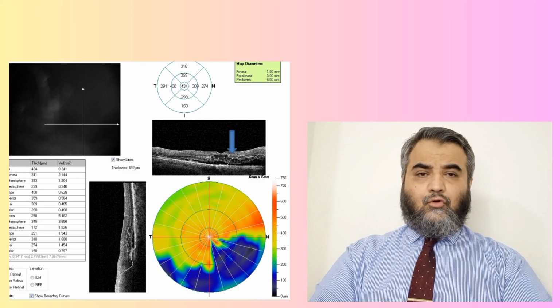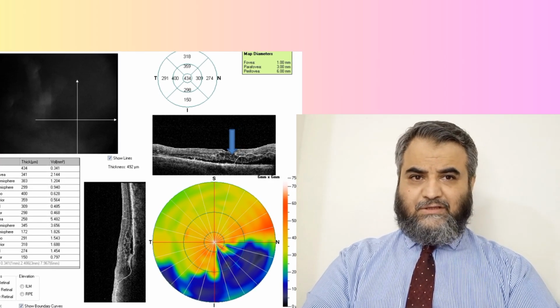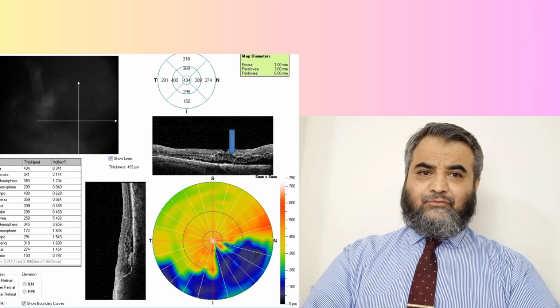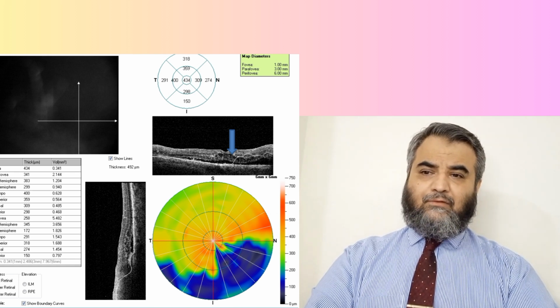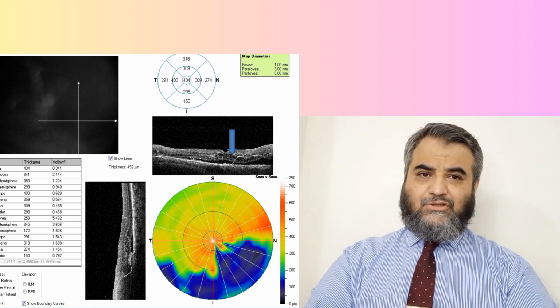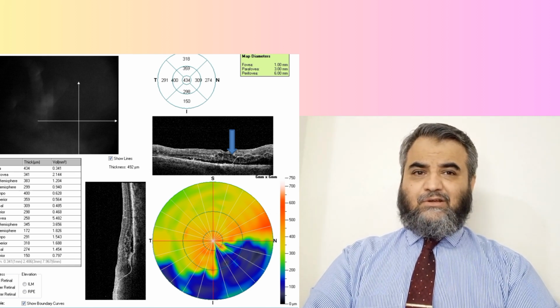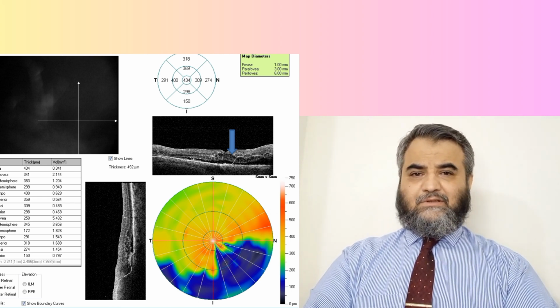See the OCT of the macula, the central area of the retina, where 90% of the vision is. In this photograph, shown by the arrow, there is subretinal fluid. All this is going on because of the infection and inflammation in the eye, which is also involving the central area, the macula. The arrow shows the darker area, how it is elevated, and there is subretinal fluid.